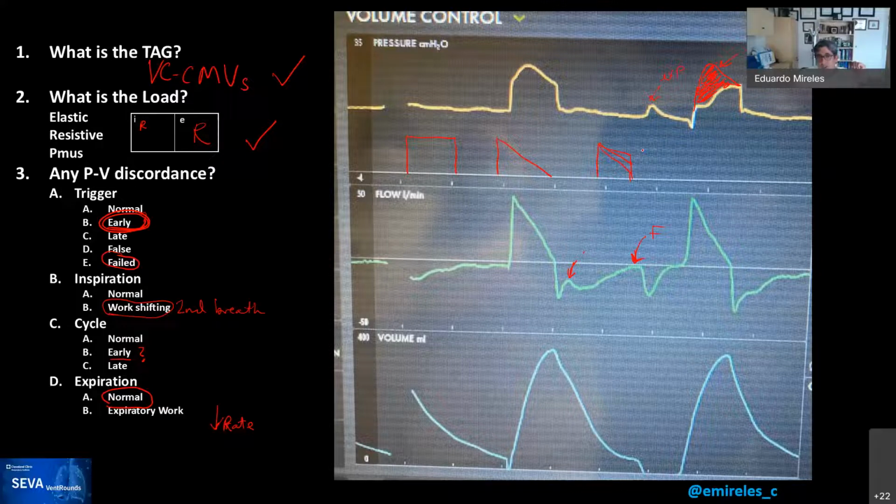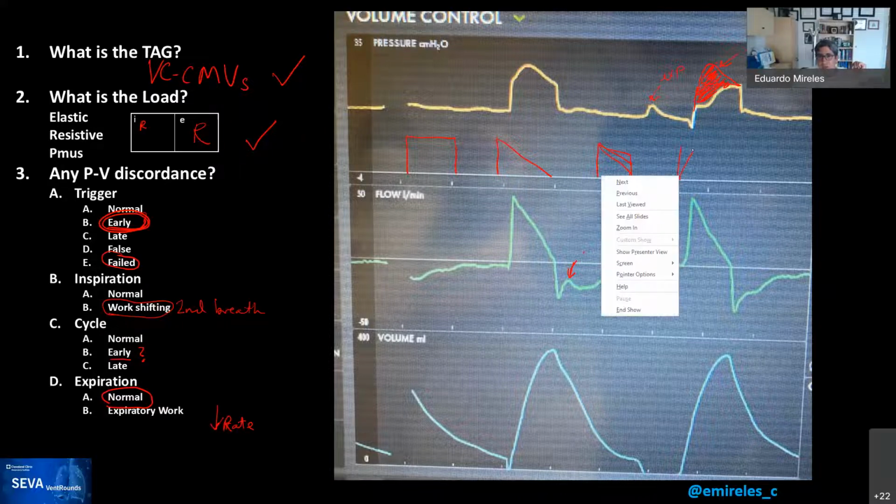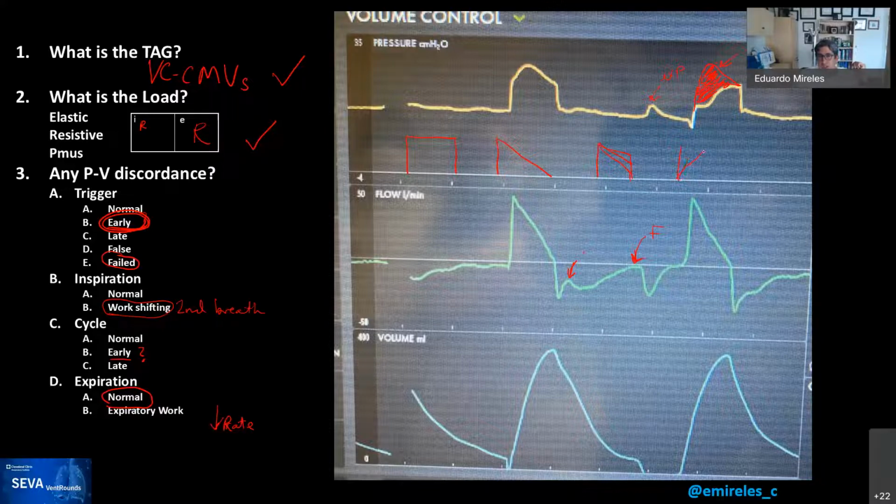The other thing that you can do is, if you so chose, you can change the rise time. So instead of rising in zero, you can rise a little bit more inclined, or more inclined, you can change it. And so you can imagine now you can actually create a sinusoidal if you were trying to do that by changing the ramp settings. I have no idea why we would choose to modify any of these settings on a patient on volume control. And so I welcome any input from anybody that has a good idea.